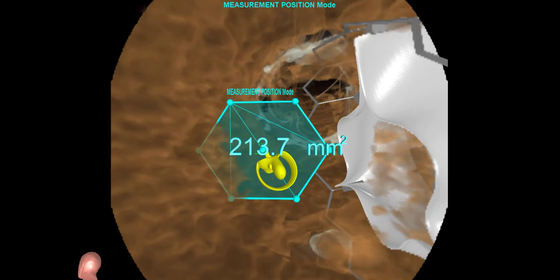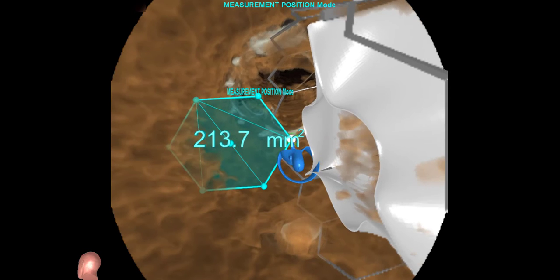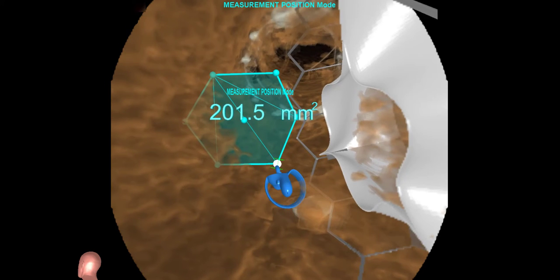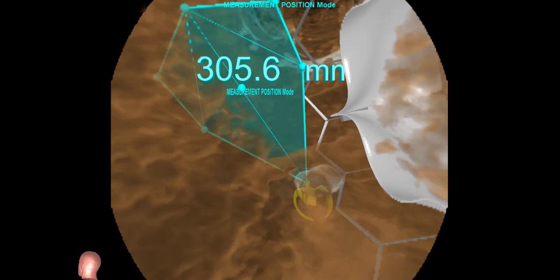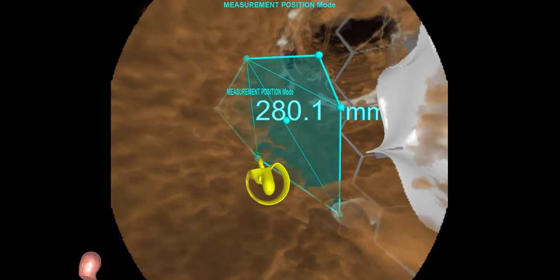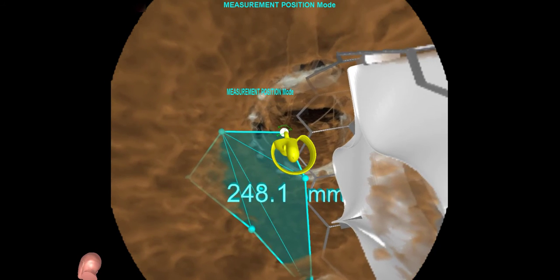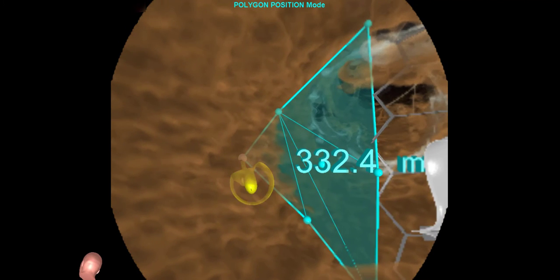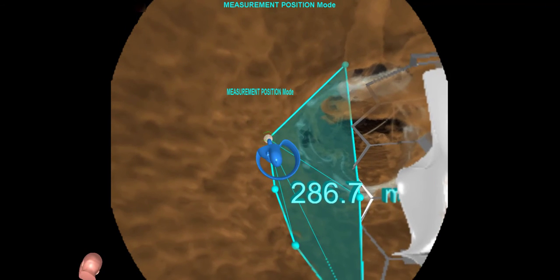So we select this polygon, and one of the nice features about VR is that we're able to place the polygon and measure the area exactly where the smallest neo-LVOT area will be. I click on the edges of the polygon and start moving them and making sure that they're at the right area by moving in and out of tissue planes or the valve planes. And generally what I do is I work my way around, sometimes going from one edge of the polygon to another until I'm fairly confident that I'm measuring the neo-LVOT.